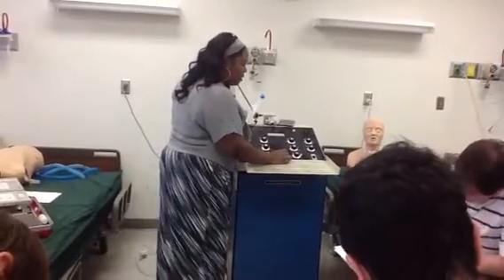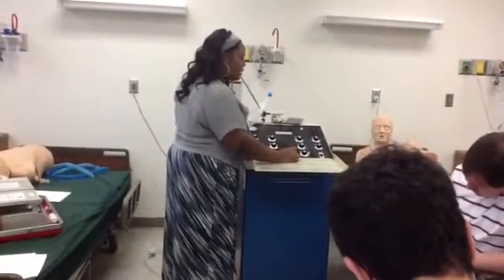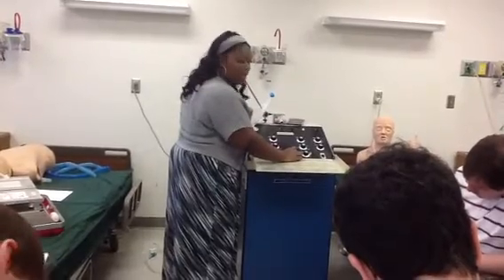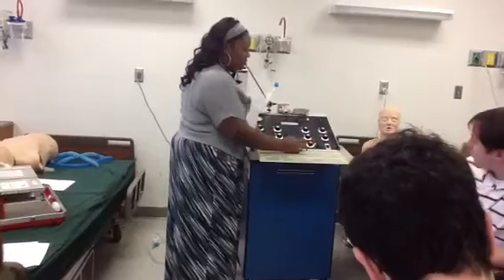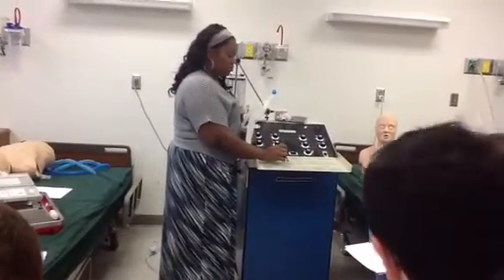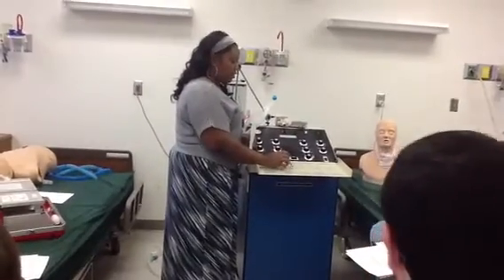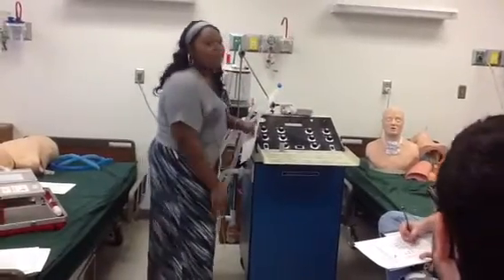I is your sigh settings. So you would set your number of sighs per hour and how many sighs. So if you set the machine to give them 6 sighs per hour, it will give a sigh how often?